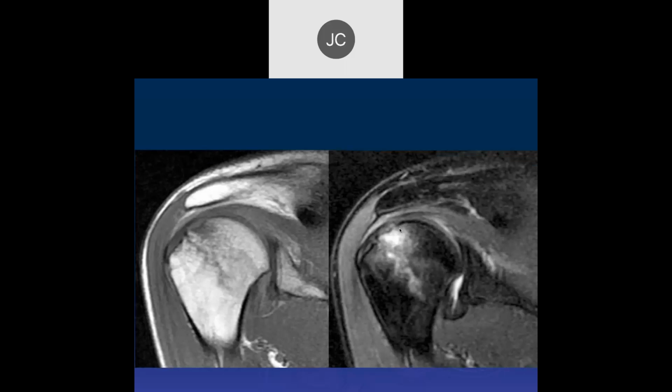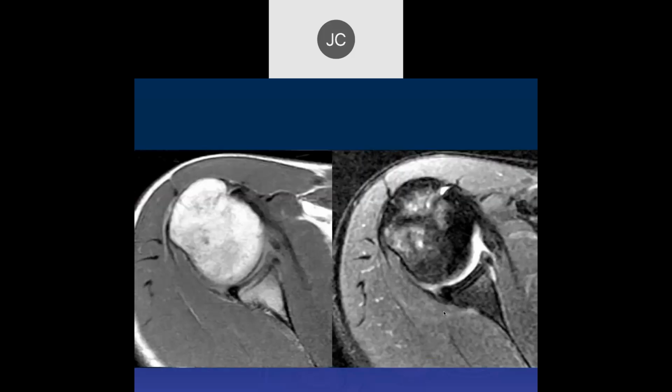Yeah, so this patient probably had a dislocation. In this case, the Hill Sachs is very superior. So this is probably more of an inferior dislocation, which is a little bit less common. And then what else do you see here on this image concerning the labrum? I see some splitting posteriorly, some fraying posteriorly, but anteriorly as well. There's a probable tear in that labrum.